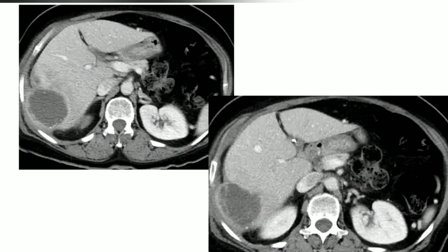What about the gallbladder? Okay, I'm looking at the gallbladder. Ma'am, I cannot see the gallbladder in these images. Yes, but we have surgical clips here. Right. Okay, so this is post cholecystectomy. So now, can you narrow your differential diagnosis?